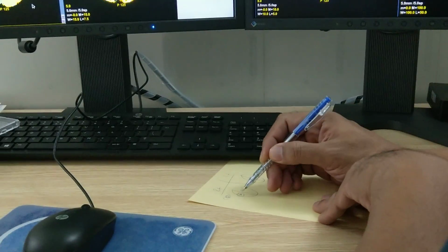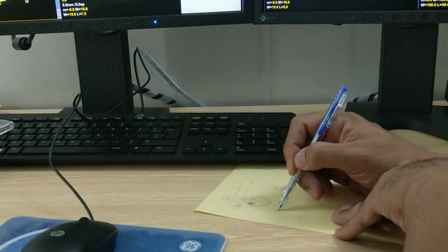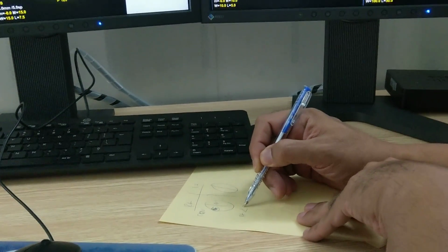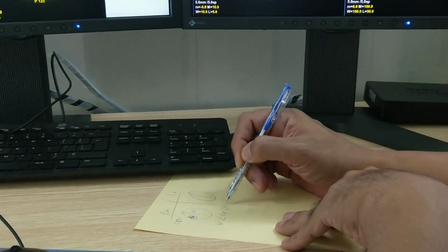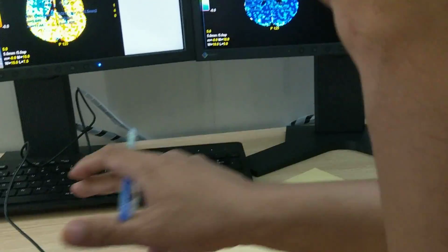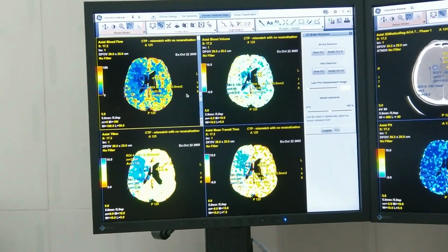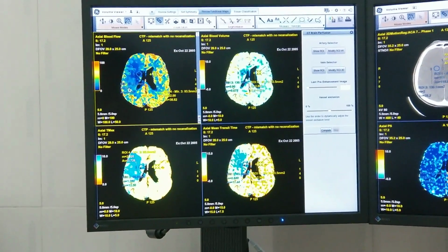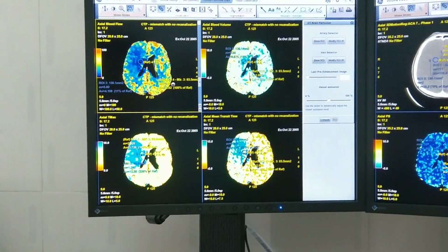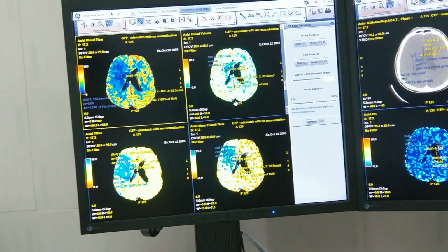So which means that this is the problem. If the right is more than 50% less than the left, you consider abnormal or infarct. So let's say you want to look here compared to here, how many percent, right? So you can actually use this normal as reference, set as reference. So it gives you percent. So only 11% compared to this. So you know it's infarct.